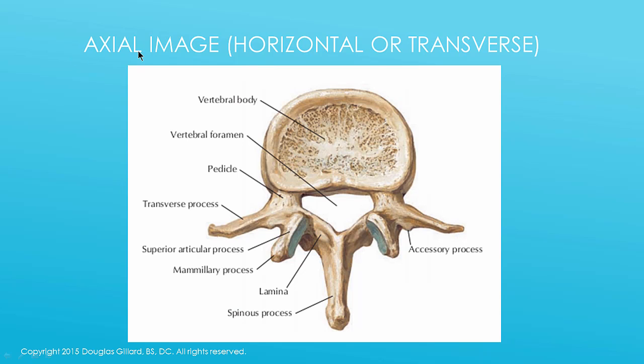Make sure you call this an axial view. It's also called horizontal or transverse view, but everybody calls it an axial view. Very rarely do I hear these words. Maybe in anatomy, but not in radiography.